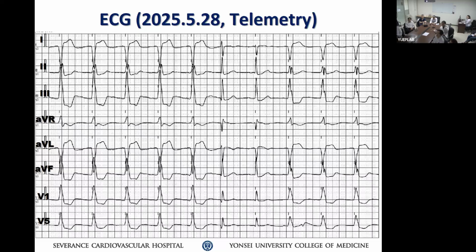But what is this here? This one, and also this one. This is very regular, looks like 1, 2, 3, 4, 5. What do you make out of that?